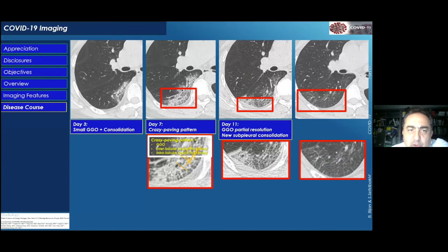Now, I want to show you something here. In this case, the measurement of this lesion, probably that's how you would measure it. But what about here? This lesion goes from here all the way to here. So this lesion is much bigger than this lesion, but the appearance is different. So we should not really only go by size. Also, we have to talk about the appearance of the disease, the architecture of the entity.